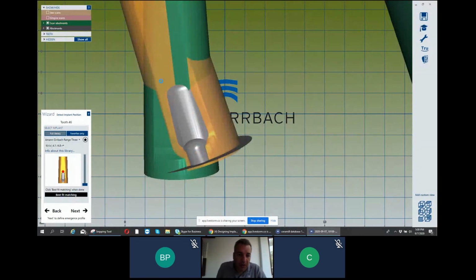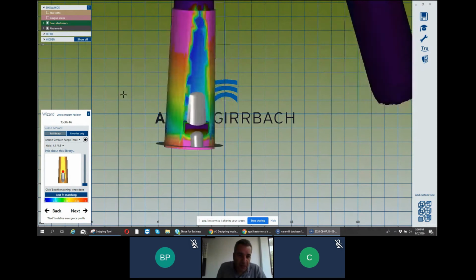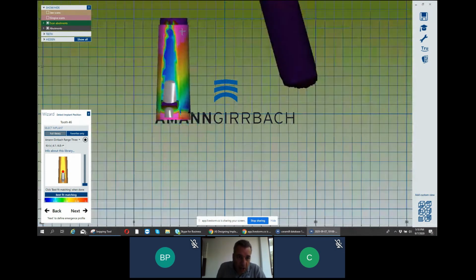Usually the adaptation will be on the flat area. Okay, so the flat area has to be green and blue. And you should place the dot in the right place, the right position. You see here, it's perfect. The adaptation is perfect. Look here, the blue is perfect on this area and in the flat area. Don't check the top, it doesn't matter. For us, it's here. Next.